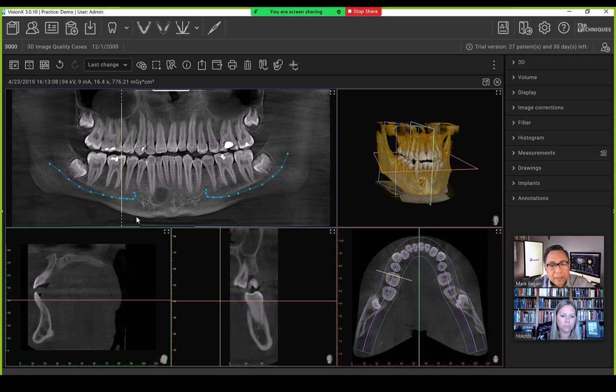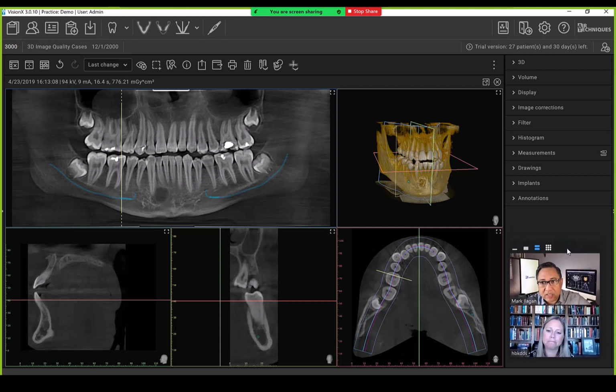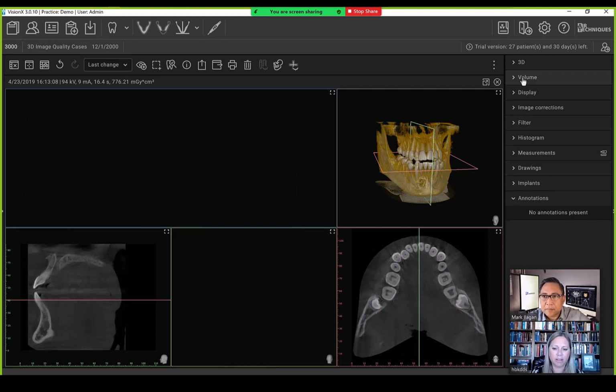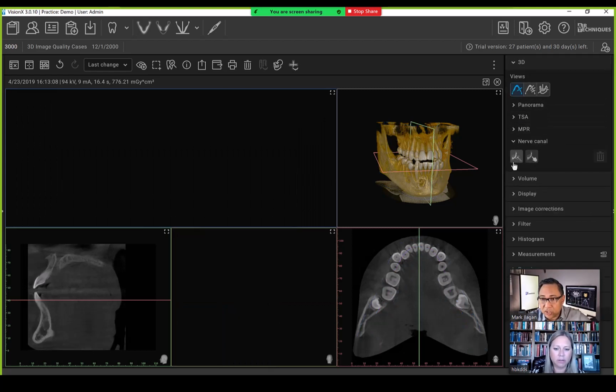So that's standard. What we do different is that the panoramic curve is automatically detected for you and drawn out for you. It's all adjusted for you, I should say. And the nerve is already mapped out using AI, but we don't tell clinicians that that is 100% accurate. So we always want to give a starting point, but we want the clinician to review it. Let me show you how that works real quick. You can adjust that then. Yeah, you could adjust it.